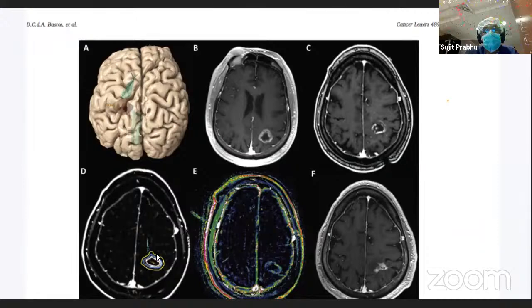the tissue interface between the yellow line and normal brain portends recovery of tissue, but whatever is within the blue line is really dead tissue, and there's no hope for any recovery within that area.